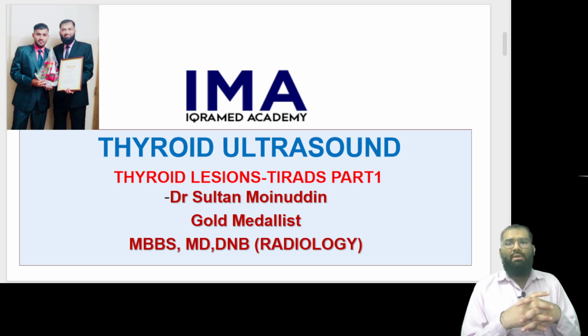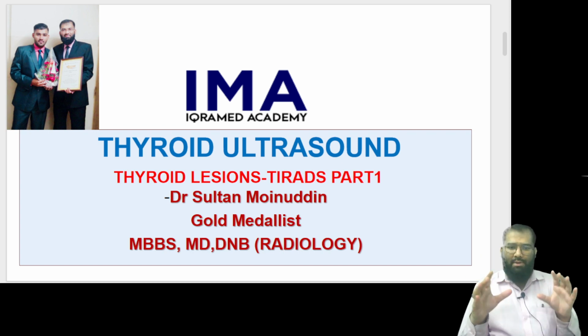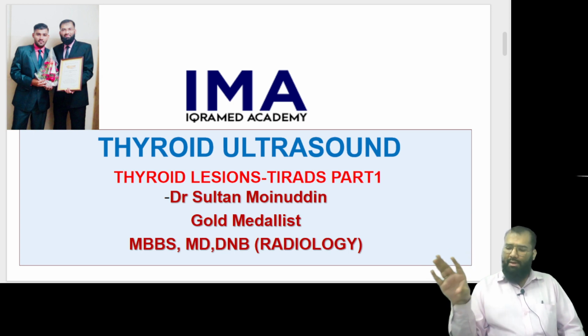So whenever you see a thyroid lesion, that thyroid lesion has to be given certain points, and based on that, we have TI-RADS 1, 2, 3, 4, and 5. Just like you have BI-RADS for breast, PI-RADS for prostate, LI-RADS for liver, O-RADS for ovary, we have TI-RADS for the thyroid gland.